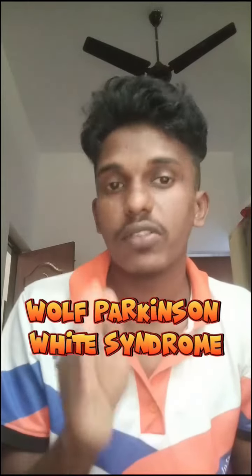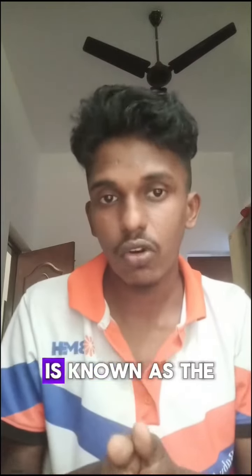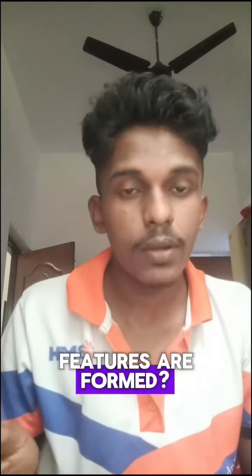This is an ECG of Wolff-Parkinson-White syndrome, or simply known as WPW syndrome. This is a type of AVRT. That means there is an accessory pathway between the atria and ventricle, and this is known as the bundle of Kent. Then how are these ECG features formed?